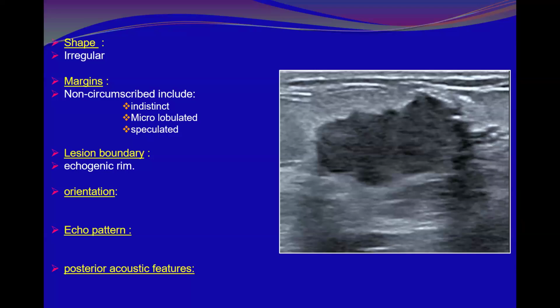But you have seen this hyperechogenicity. Here it is not sharp. It is not uniform. It is not thin. You see, it has variations. It is indistinct. It has variable thickness from here to here. Okay, so this is an echogenic rim.